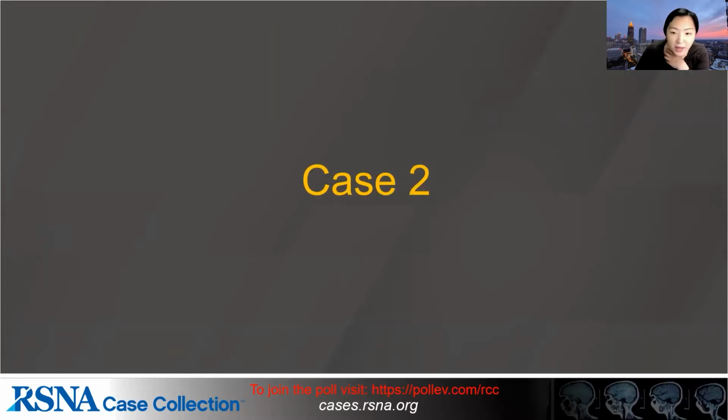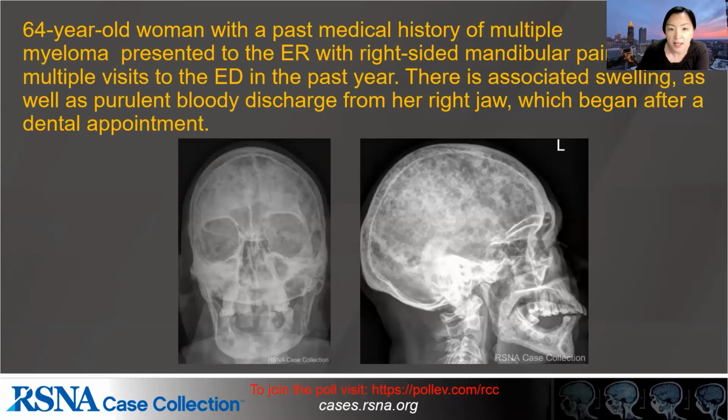All right, so we'll move right on into case 2. This is a 64-year-old woman who has a past medical history of multiple myeloma, and this is an important point.